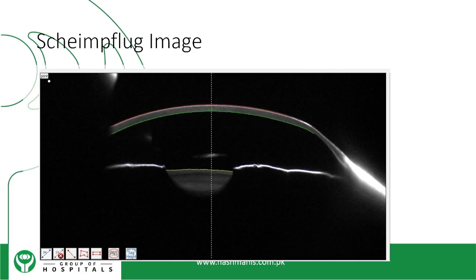You see the segmentation actually ends right where the thinning of the cornea starts. So that's why we have to look at this image. Once we look at this image, either this or an anterior segment OCT, you can see the thinning is there and it's in the inferior region.